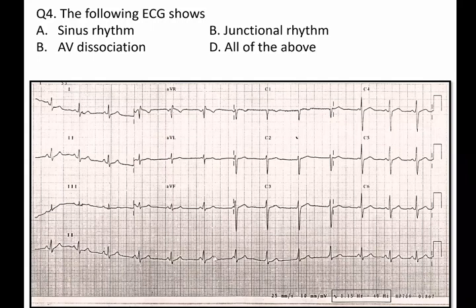Now the sixth QRS, and from then on you find that the QRS complexes look the same, but the PR interval is shortening, and then the P wave actually gets lost in the QRS. For the last two QRS, you have the sinus rhythm again with normal-looking QRS and normal PR interval.